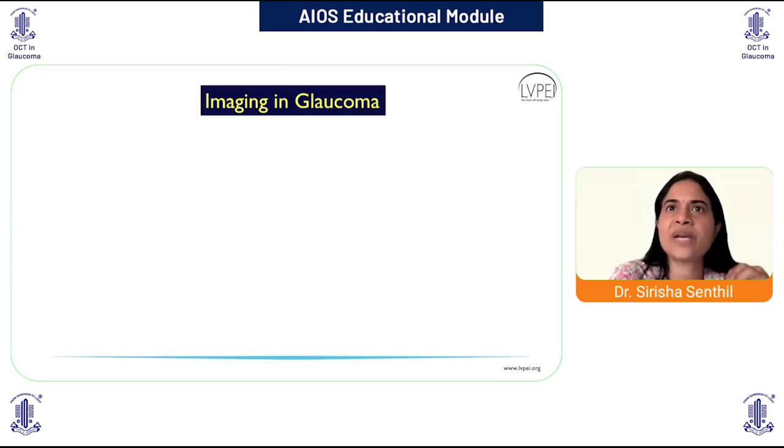Another example we saw was where the visual field defect was persistently present. The OCT did not reveal the change on an RNFL map, but the macular GCC showed a defect that was similar to that of the 10-2 on the visual field, but on clinical evaluation, they were not correlating. So you have two imaging devices that are correlating, but the clinical picture is not correlating. So go back and relook at the eye, because you're missing something there.